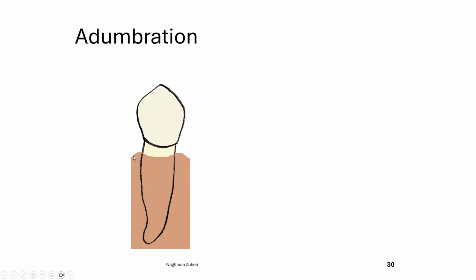Why does it occur? The bone is quite radiopaque, and the enamel of the crown is also quite radiopaque. It is a three-dimensional object, and the X-rays pass through it, casting the image on the receptor. At times they miss these edges. They are not fully exposed. That is why we get that radiolucency in that area.